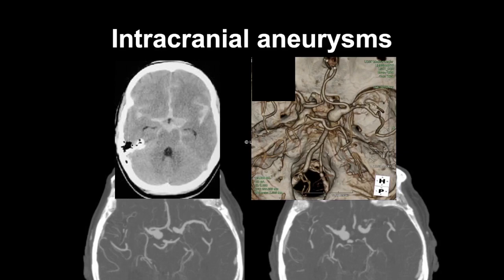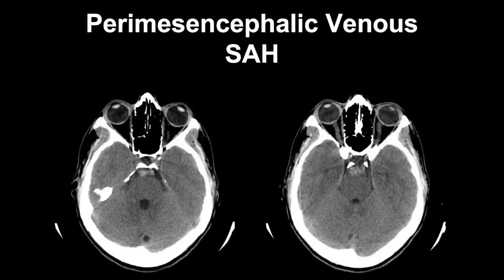And you can see that in this patient, that pattern was caused not by an arteriovenous malformation, but by a quite large supraclinoid internal carotid artery aneurysm on the right side. And here, because it's a 3D view and we look from the top, it shows up on our other side, but it's still the right side of the patient.